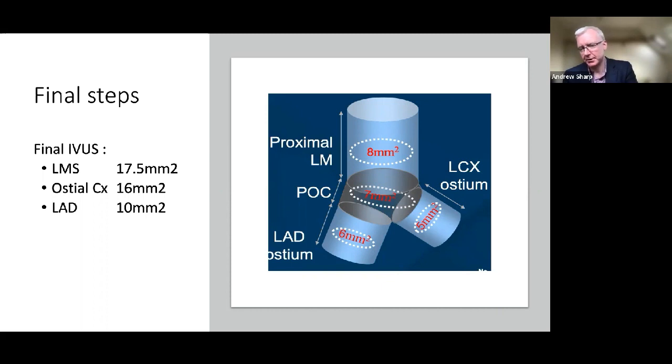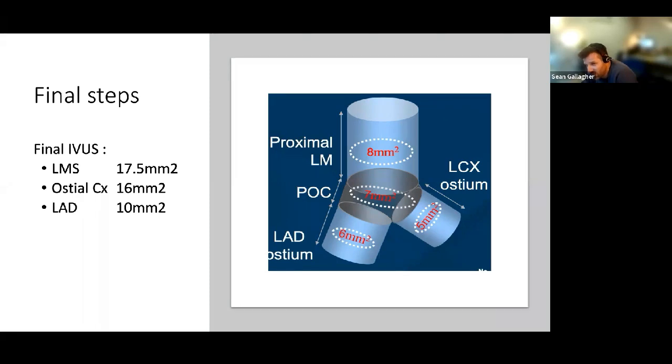And just to follow up on your comment about, well, he did okay. Well, he did okay. But if you do 10 cases like this, I'm not sure all 10 would do okay for 8 years. So I would also say, Andrew, that if you just crossed over circ to left main and left a load of crushed metal around, what's his stent thrombosis risk then?